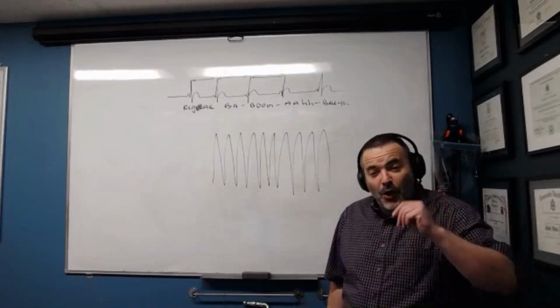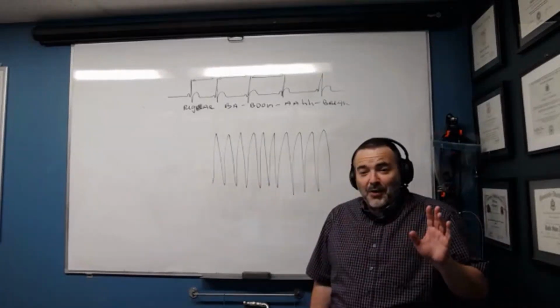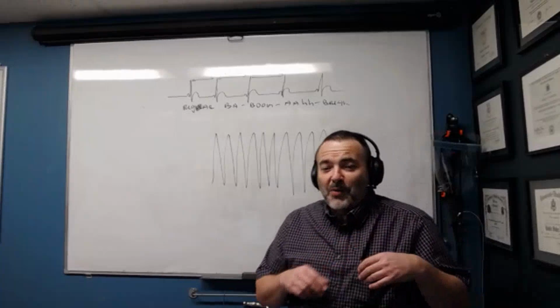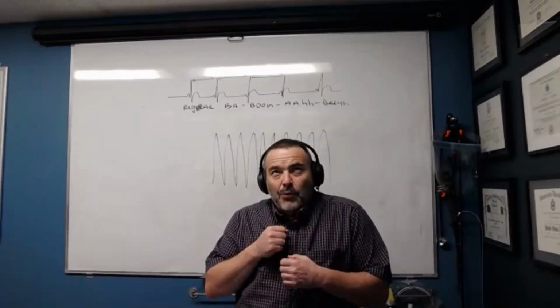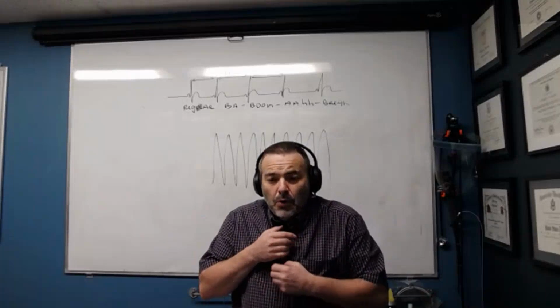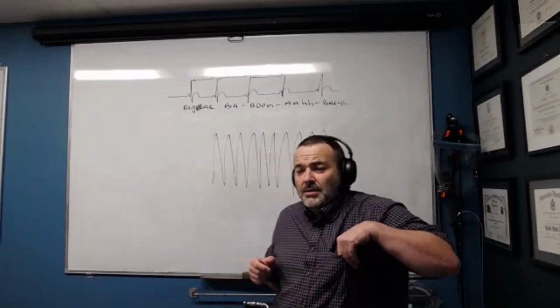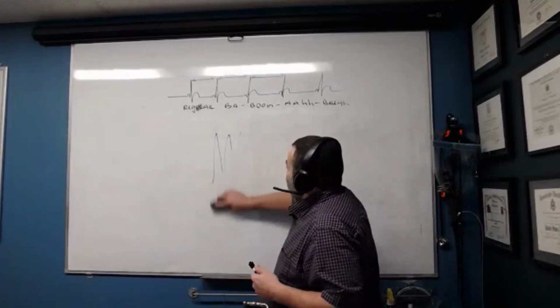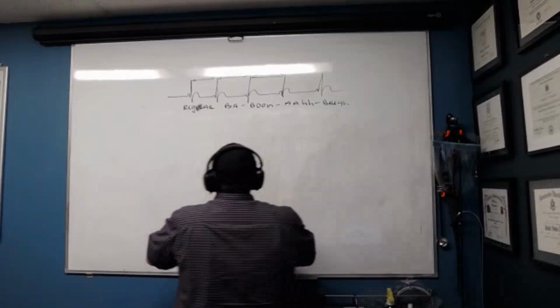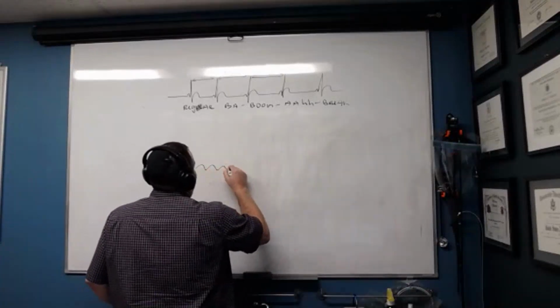But I didn't call any of these rhythms by their official names. All I want you to walk away with today is how it sounds to you. Ba-boom, break. Ba-boom, break. Or ba-boom, ba-boom. You could have a slightly different rhythm. Here's another one. You can probably guess how that works.